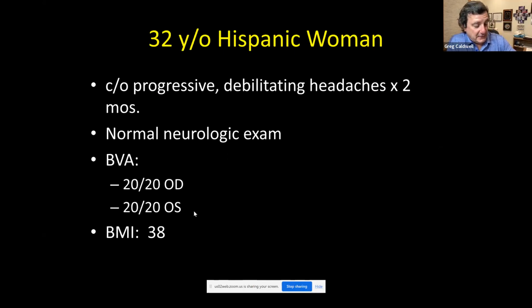I know sometimes it's like talking to a screen, as we've all done. What I would encourage the audience to do, if you have this type of technology, is to start imaging optic nerves that are normal, so that you can get a baseline of how that RPE is supposed to look without that inward deflection, because it's always hard to tell on these kind of anomalous nerves. So take a nerve that is absolutely not even questionable and start imaging, and look at 10 to 20 different patients to get the normal deflection of that RPE.